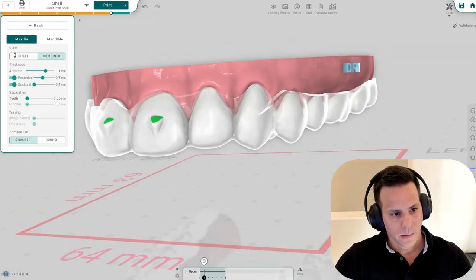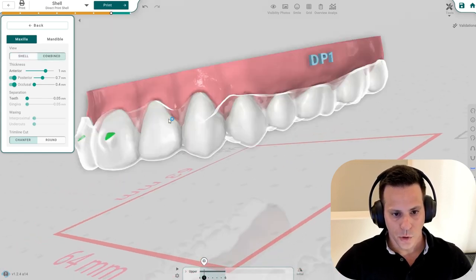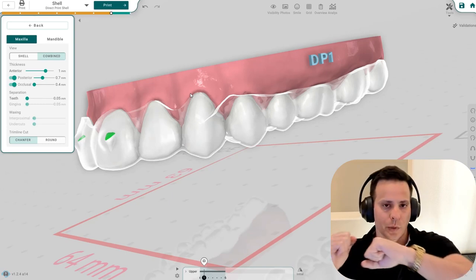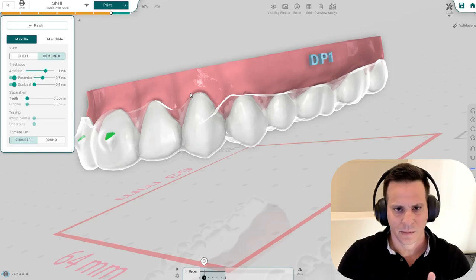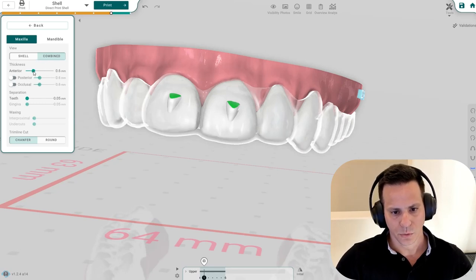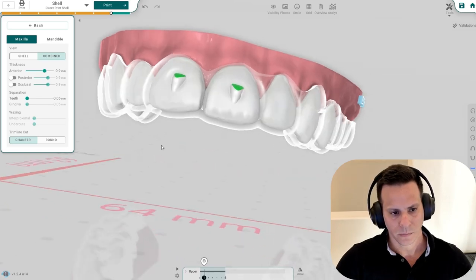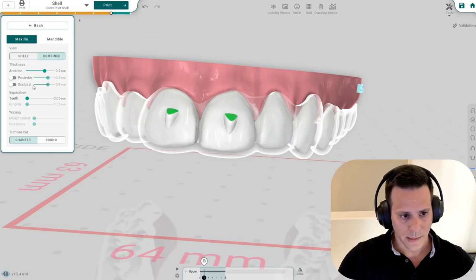That way you can still keep your strength on the top, in the middle section where the forces are being applied, but on the places where it touches the other teeth, it's not that bulky. It's options, play with it. You can enable it, and playing is almost real time. You just click and it updates right in there. Now, another option that we have is the separation.